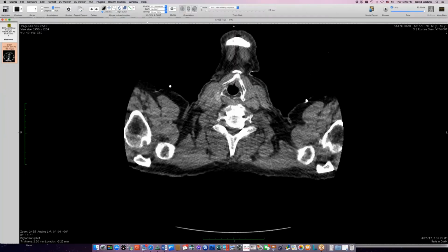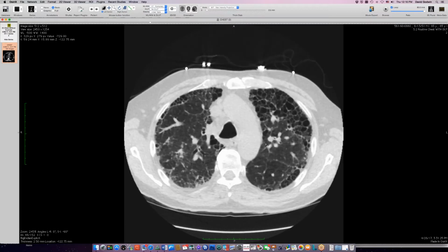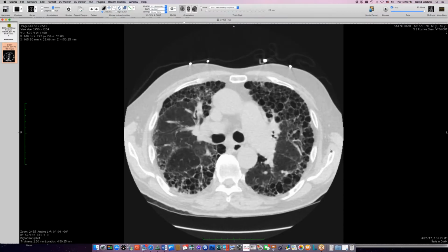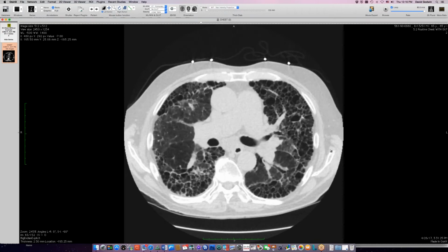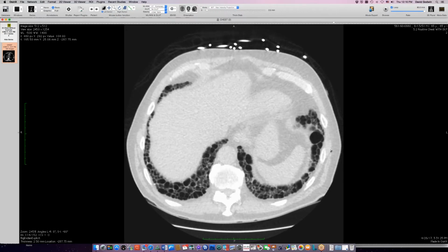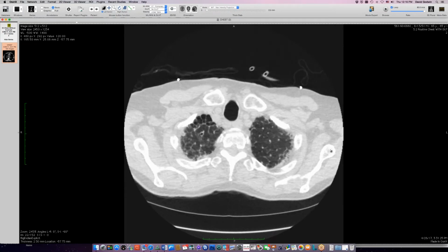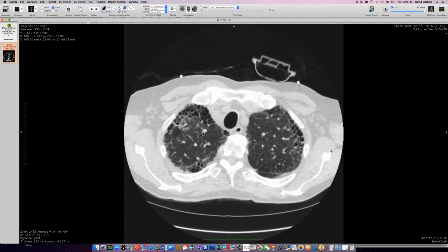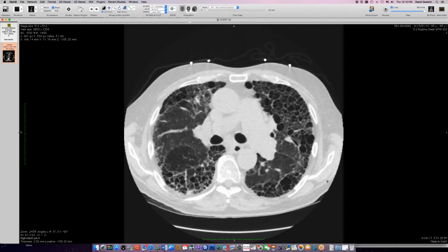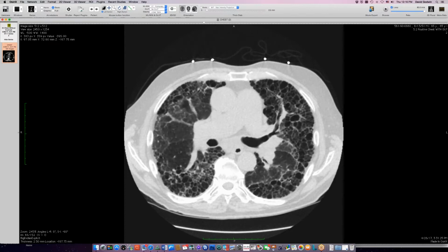So he had a CT scan, and it shows that these lungs are abnormal. We have this pattern that was called honeycombing. You can see he's got these stacks of cysts out against the periphery. But what struck me about this is the amount of upper lung involvement. It seems to go all the way almost over the apices, over the apex on the right and almost on the left. And then the very thin-walled nature of these cysts here. So it looks to me as if there are these holes in the lung, but not a lot of fibrosis.